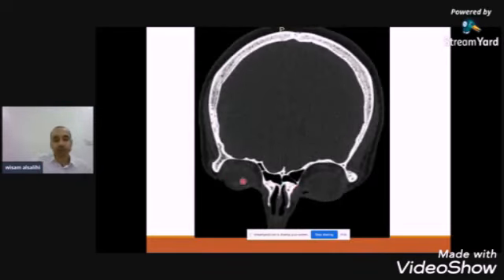And this is another patient, to see the lamina papyracea. This is the septum. This is the nasofrontal beak. If you see this picture and there is continuity between the lamina papyracea and the nasal septum, then you are in the frontal sinus, not the frontal recess. This is the frontal sinus because there is continuity between the lamina papyracea and the nasal septum, with bone in between.